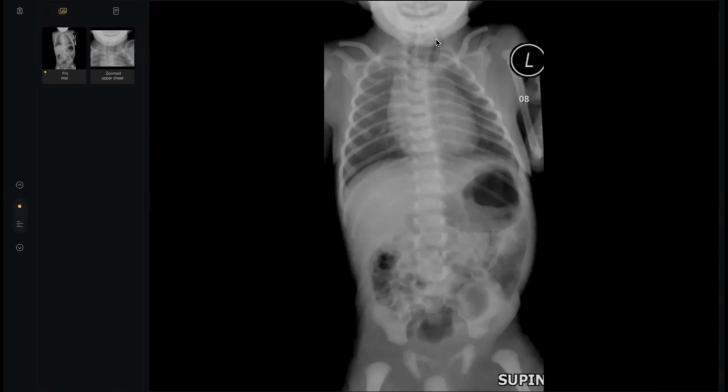I think it is going through the nose, and then it goes upwards back to the oropharynx. See, the tube here in the esophagus. Why has it stopped here and gone up again? What happened in the esophagus? Oh, there's an atresia, sorry. Yes, esophageal atresia. Okay. Look distally. Is there or is there not a gastric air bubble? There is a gastric air bubble in the stomach. So is this atresia associated with a fistula or not associated with a fistula?